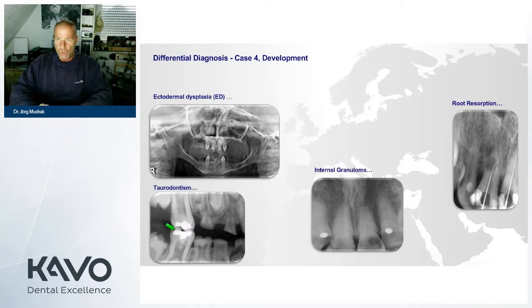As I mentioned before, in this case, anything is referred to teeth. So when we talk about adjacent structures or neighboring structures, we talk about dentine, not bone. If we talk about lucency, we talk about the tooth and not about a bone defect.